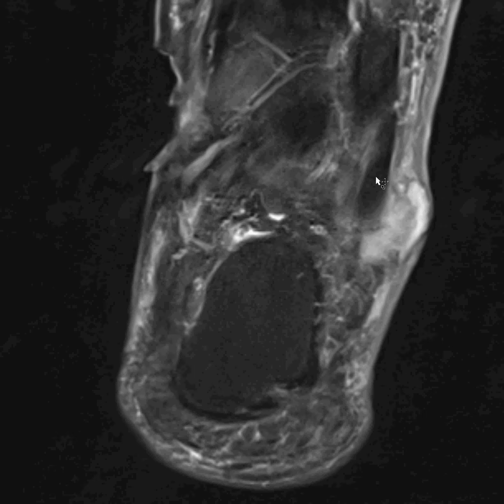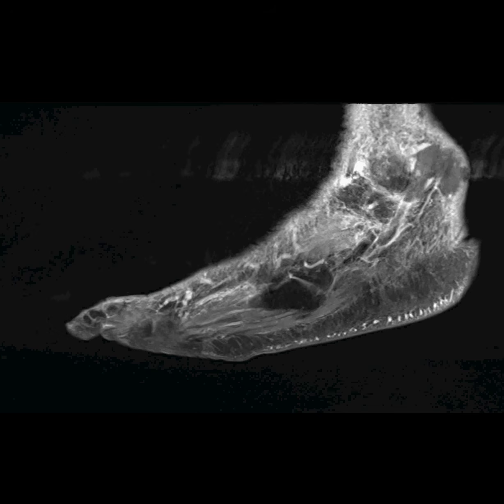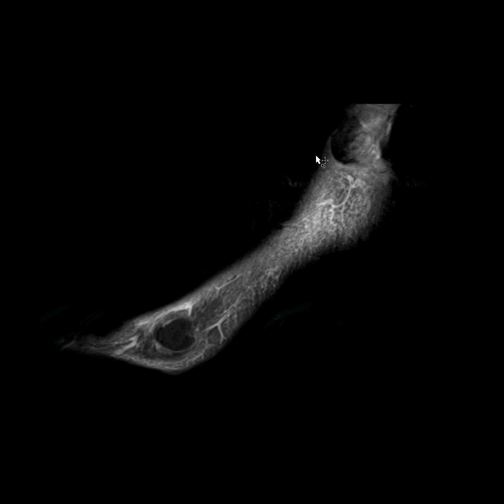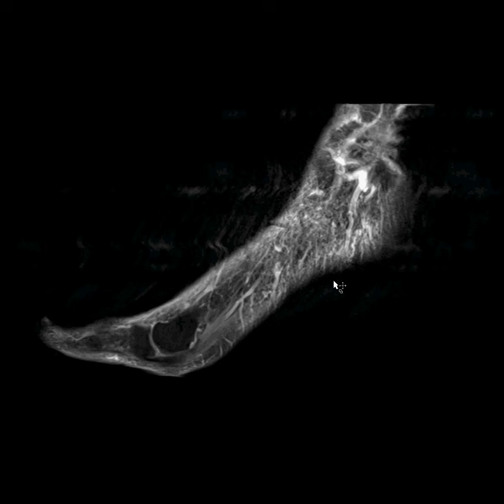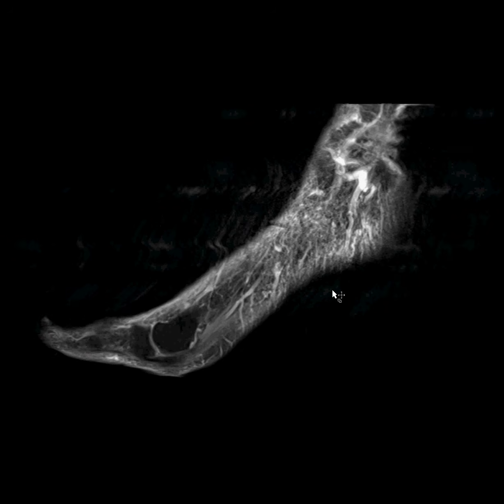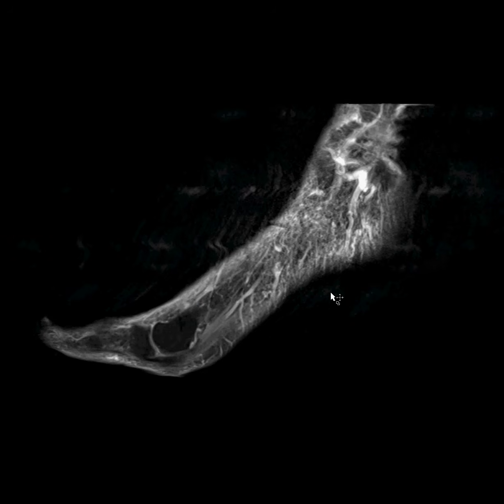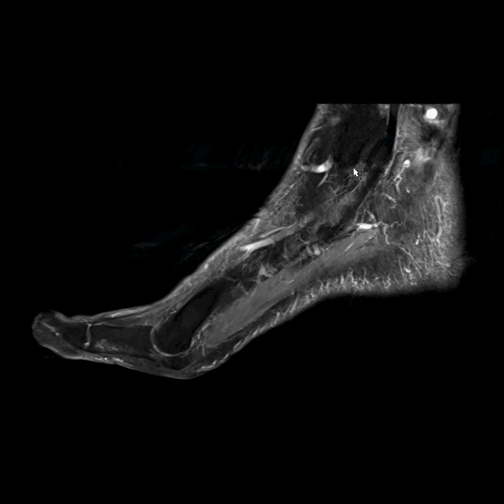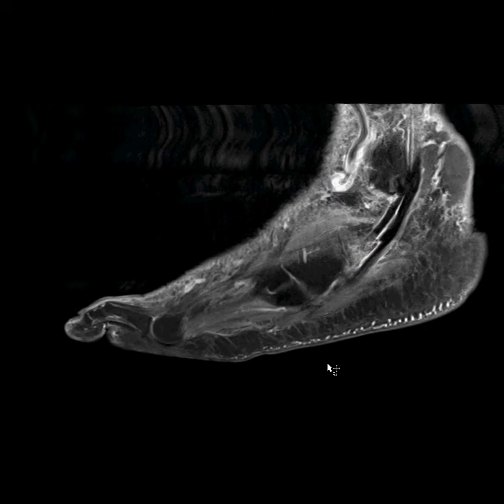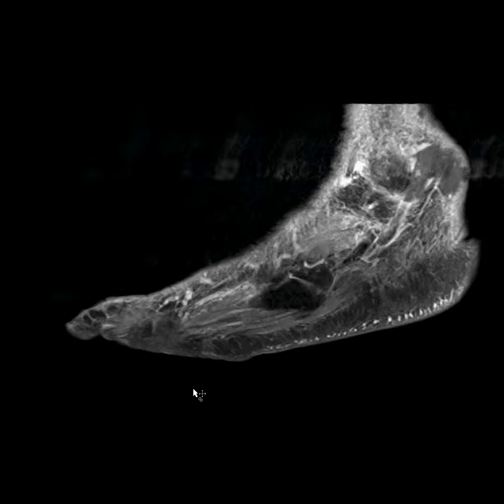But instead, a lot of time in this exam was spent on sagittal planes. Now, sagittal plane, you can usually see problems, like maybe this is part of that medial ulcer, but because of partial volume averaging and being in the plane of the lesion, it's hard to make any important calls about their relationship to the other structures. And the fact that we don't have axial images is a problem. The sagittal images are kind of nice, broad pictures of the whole foot, but they don't help in this case to identify the localization of these abnormalities at the ankle.